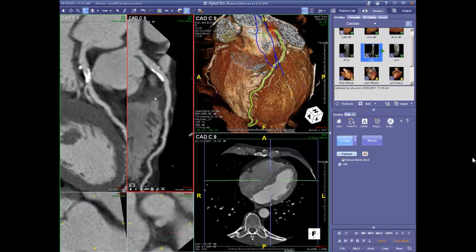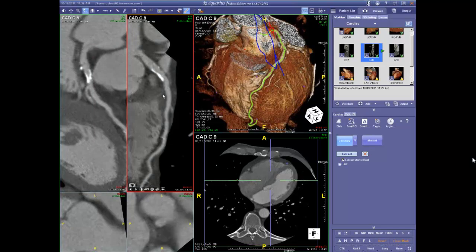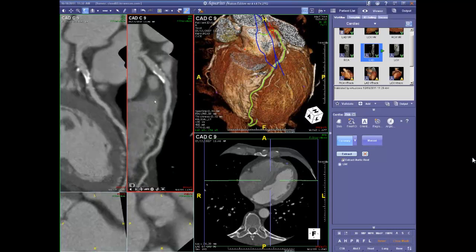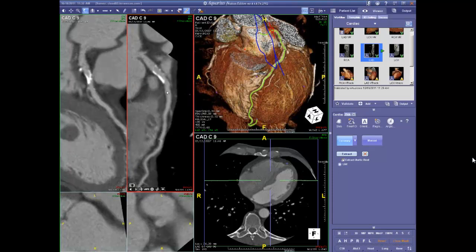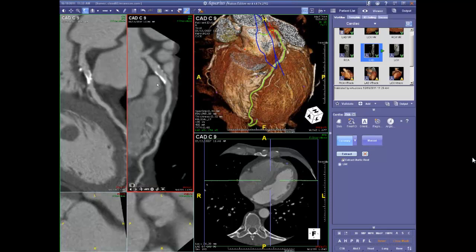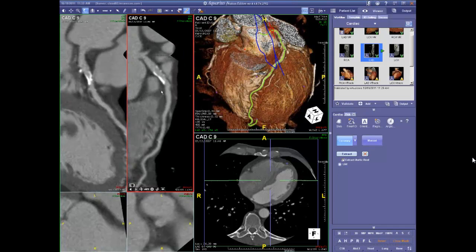And others in attendance, and I know Dr. Adams and Turner are very experienced readers, I would feel quite comfortable in saying that I've got a view here that tells me that this plaque is not of an obstructive nature. Now it's proximal, it's clearly in the left anterior descending, it's an important left anterior descending vessel, and there may be downstream disease, but at least at this very high priority position where so many of the clinically very noteworthy acute clinical syndromes develop, I think there's very low likelihood, and actually there's really not the suggestion of any uncalcified plaque here. So in distinction to what we saw on the right, this would be calcified proximal non-obstructive disease.